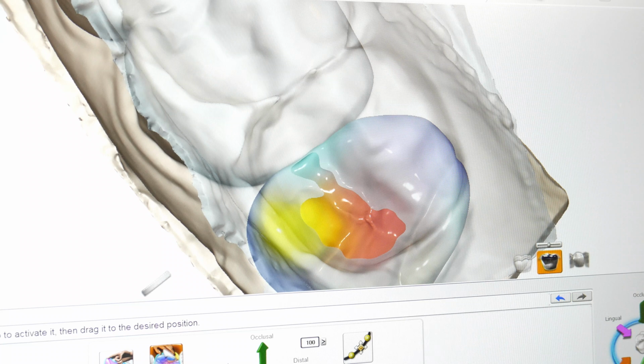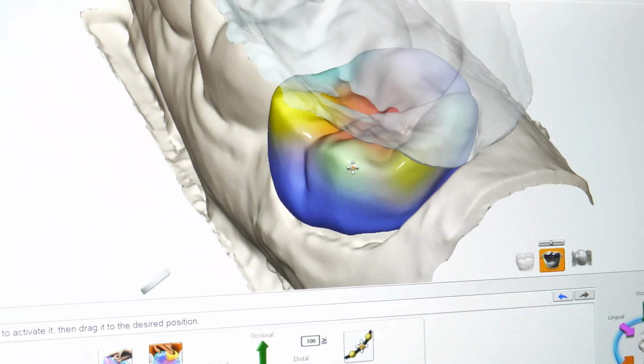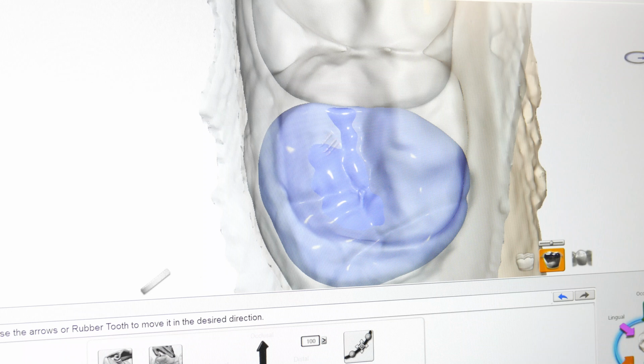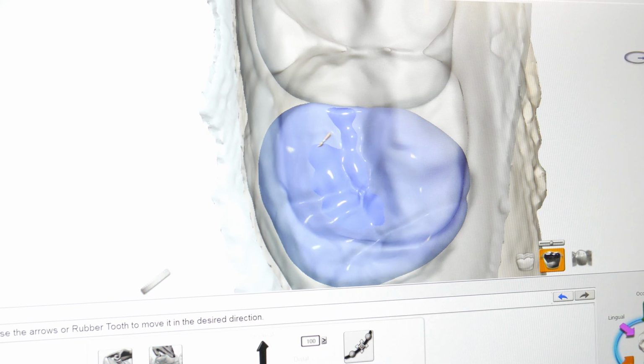I'm going to use the move feature tool, bring it gingerly and angle it inward a little bit. Still good on thickness. Now I'm going to take the paint tool because of the very thick blue areas. I want to adjust specifically that area without thinning out this area. So I'm going to use my paint feature, again my favorite tool for small areas that I want to adjust. Okay, we're still good on thickness.